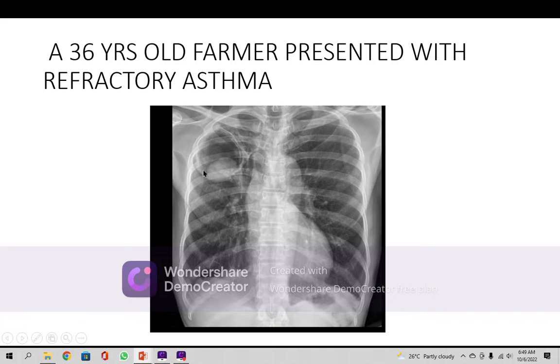It falls in the pulmonary eosinophilia, and the other differential may be the possibility of tuberculosis, chronic inflammation with tuberculosis. Yes, it may be an abscess, these are the chances, because clinically it is not like this. And the other differential may possibly be a hydatid cyst; the exocyst should be there, the endocyst should be there very clearly with fluid levels, and there are no fluid levels here.